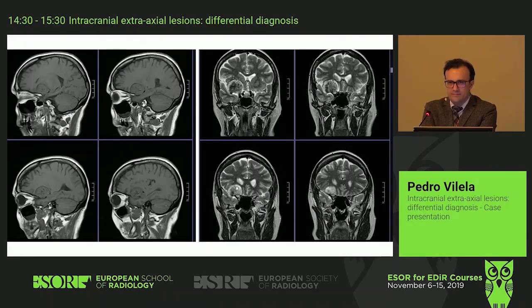I think there's an intracranial extra-axial mass. Perfect. With the CSF cleft around it. And I think it's a sphenoidal wing meningioma. Why do you think it's actually from the sphenoid wing? It's anatomically. You are completely right. I think anatomically it's just around that area.